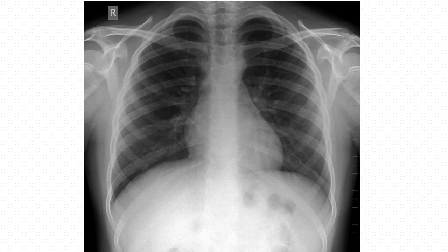Time for the mandatory exit exam. Please take a moment to identify the pathology found in this chest X-ray. If you still can't find anything after watching this lecture, congratulations. This is a normal chest X-ray and you have passed.